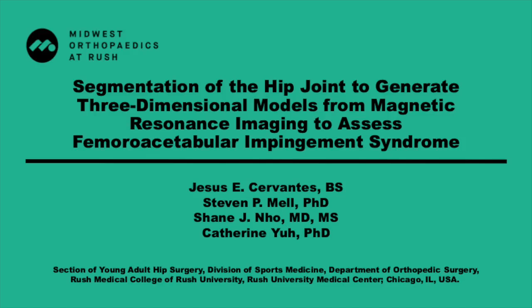Hi, my name is Jesus Cervantes, and in this video I'll be walking you through our segmentation process for generating three-dimensional models of the hip to better assess femoroacetabular impingement syndrome.